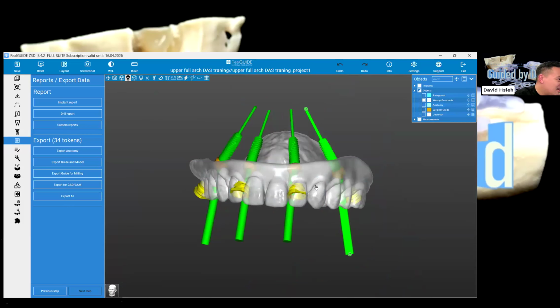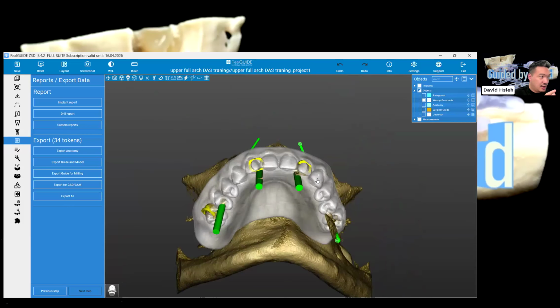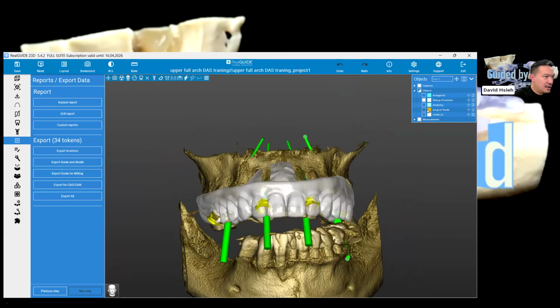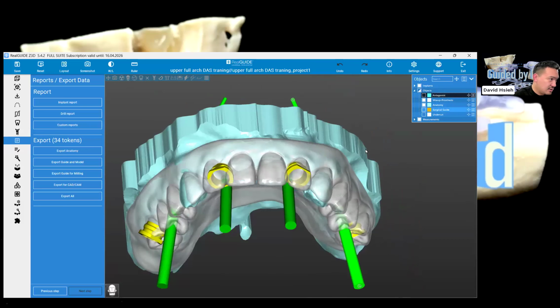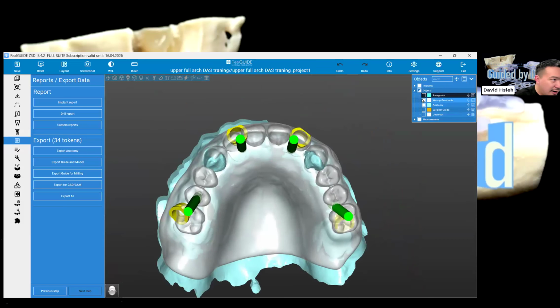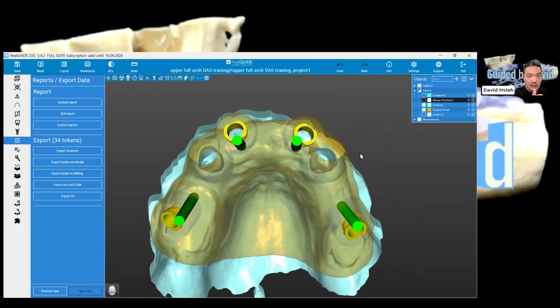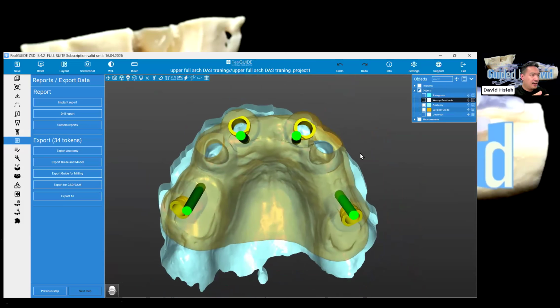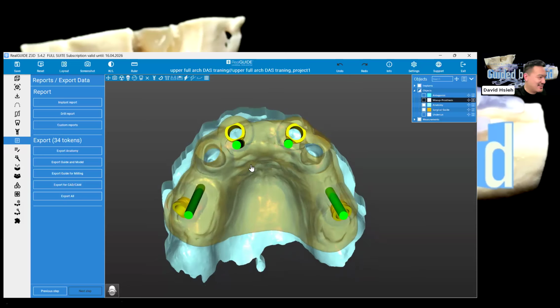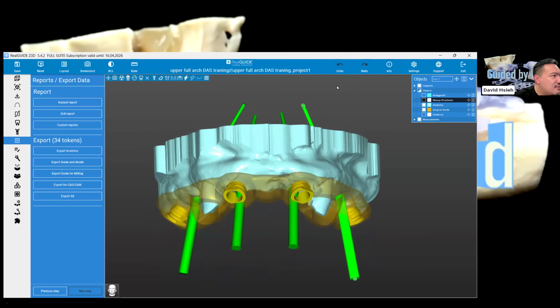We converted everything we learned today into a real design session, using a simplified way: just take out the teeth, keep two canines there, and then seat the teeth/mucosa supported guide on top of it, and then we raise the sleeve. We can still use the different offset implant drivers after the osteotomy, and we can still see the implant at the exact position that we planned. Cool, right? So this is the planning session for that.